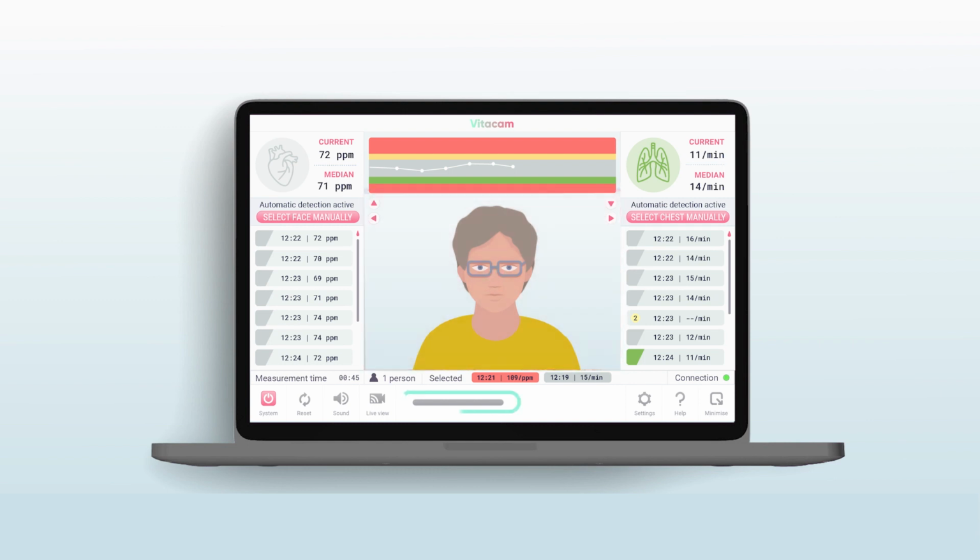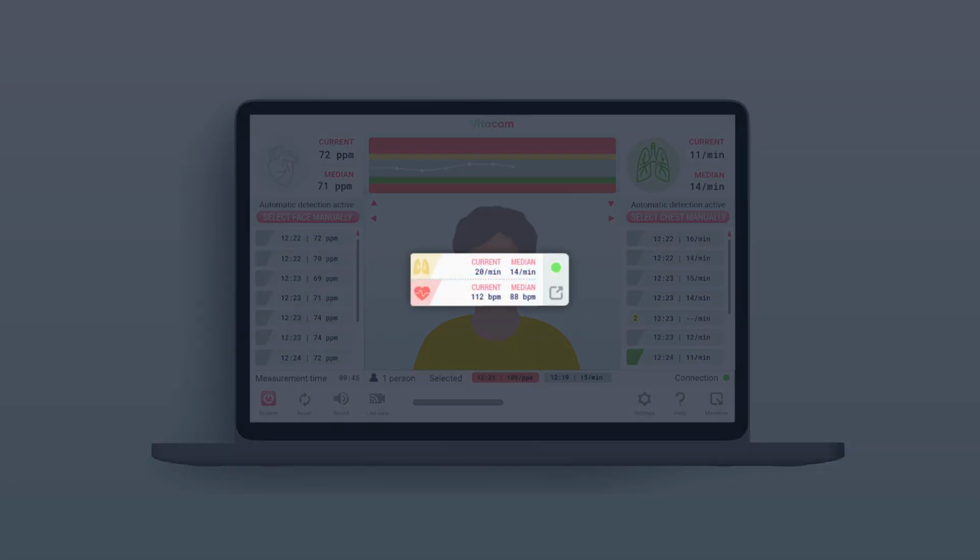The center of the panel houses a progress bar, visible while the application is searching for a face and during the first calculation before first results are displayed. The bar moves from side to side when searching and begins to fill up when calculating. Finally, on the right-hand side of the button panel, you can find buttons for settings, providing several customization options, as well as the user guide and a button for minimizing the application to its widget format. As a widget, the application takes only a small amount of space on the screen and displays only the most important up-to-date values.